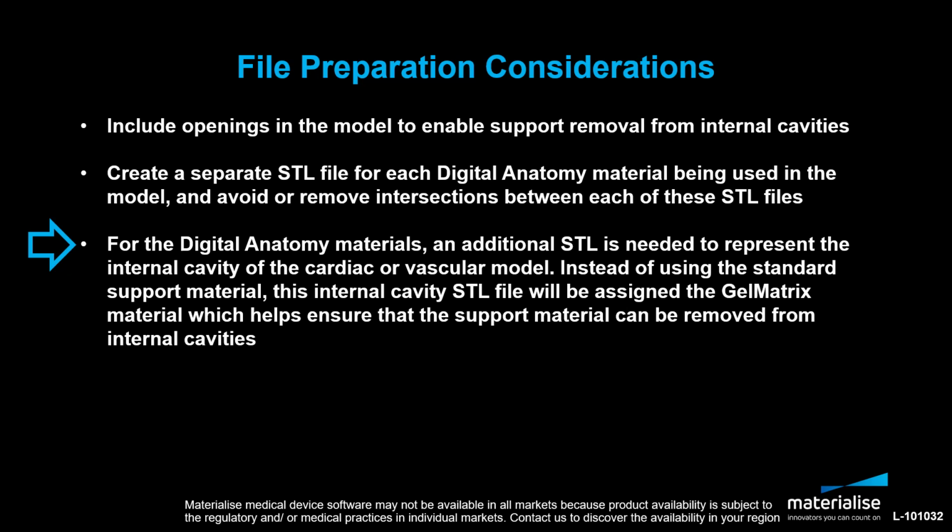In summary, we have demonstrated how an internal cavity STL file can be generated using Materialise 3-matic so that cardiac or vascular models can be 3D printed using the PolyJet Digital Anatomy materials.